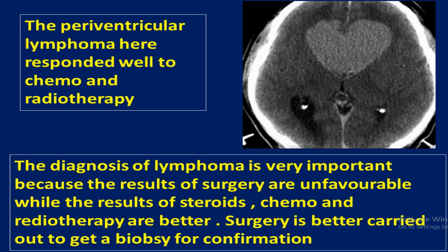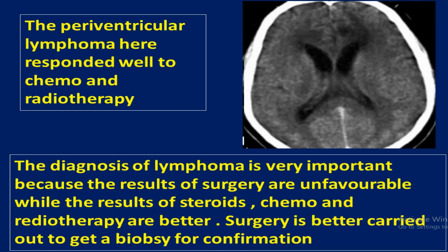So, this is the post-management CT brain follow-up, showing nearly complete disappearance of the lesion after radiochemotherapy and steroid therapy.